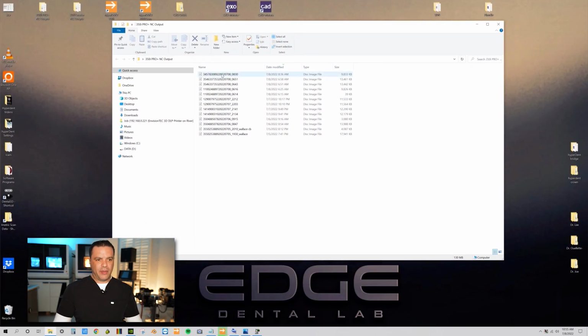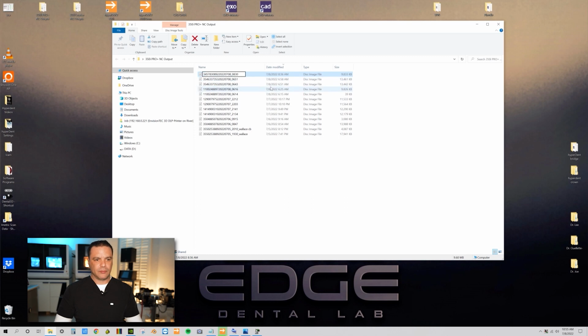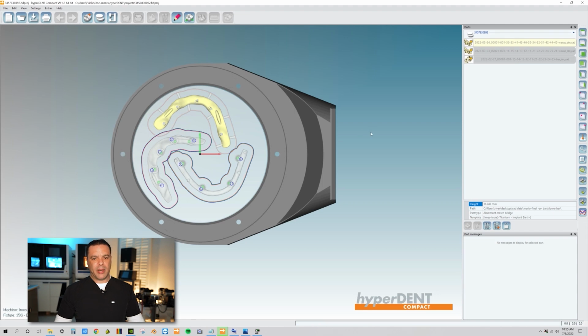Okay. Now, the original NC file folder that was generated was this 0830, right? So I'm going to right click, and I'm going to rename it. What I like to do is always underscore, okay, underscore, and I'm going to write bar full, okay? And then there you go. The original project was named bar full, all right? So come back over here, and we're going to come back to the project.